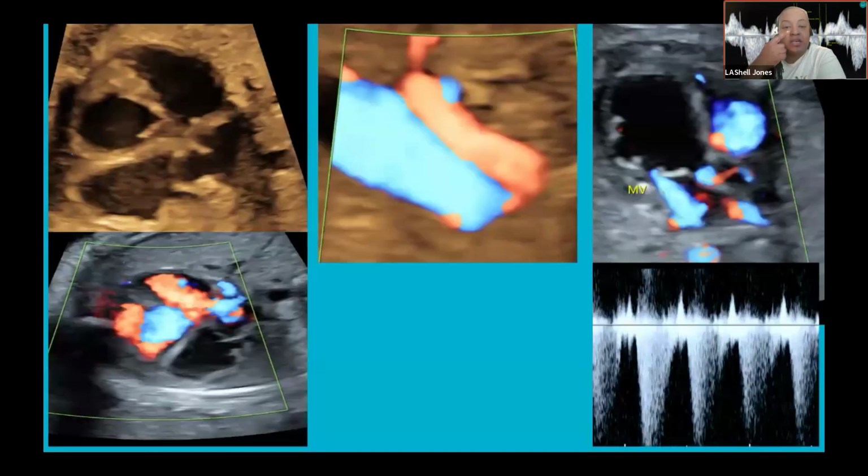All right, so here's that case that I was referring to earlier. We had a case of a patient, a late transfer. These are some of the pictures that were acquired from the exam. As you can see, it is a third trimester case. Right away, you notice the enlargement of all of the chambers throughout the heart. And looking at the heart before we apply color, who would have thought that there would be absent flow in the left ventricle, which you can see here. So there was absolutely no flow seen in that left ventricle.